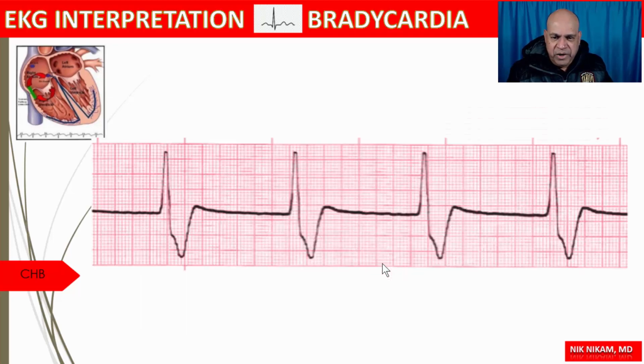Before we go into the treatment option for that complete heart block, let's look at some examples of idioventricular rhythm. As I said, the idioventricular rhythm is an escape rhythm. When the junction doesn't kick in, the ventricle starts its own rhythm. So we have an idioventricular rhythm with no P waves, wide QRS complexes, and discordant ST-T changes.